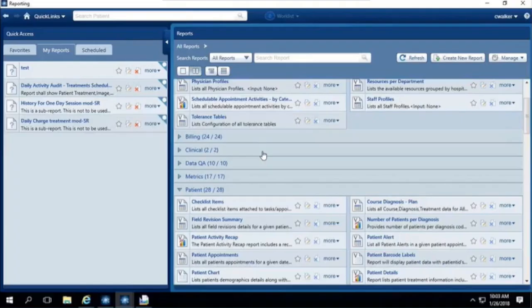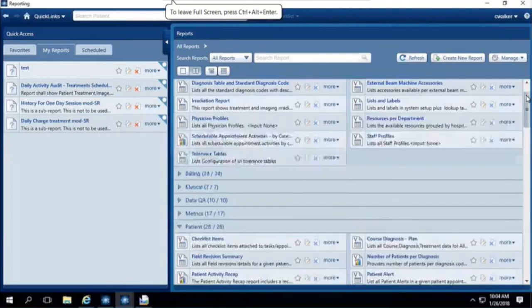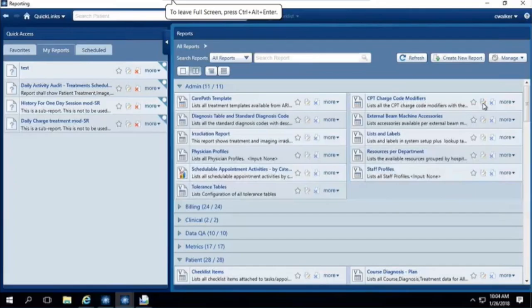And what I'm going to do is, instead of wasting time explaining how we can do this, grab a report and open that report up. When you look in Aura, you will have the ability next to any of your reports, if you look at this little hyperlink over here that says Edit Report, regardless of whether you're in 13.7 or 15, it's going to allow you to click on that edit. It's going to open up Report Builder.